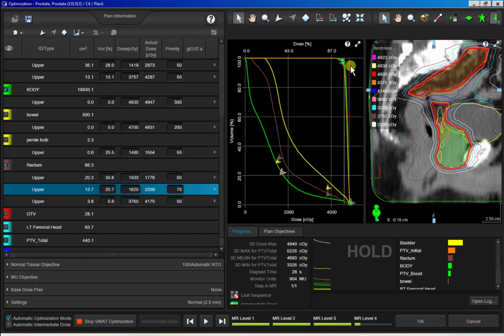Okay. Also a good time, if it does that and you're not happy with your plan, we can back it up to level 2 or 3. If you're going to go to level 1, I suggest starting all the way over. But there are certain times where I think it's appropriate to back it up to level 3 and level 2. And again, we'll talk more about that as the semester goes on.